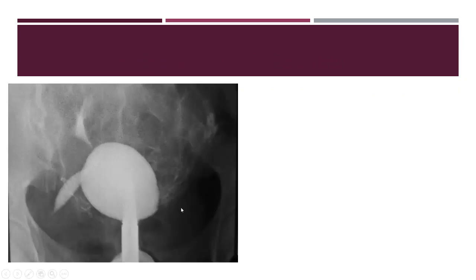Oh, what about this case? I have two endometrial horns, but what is this? It was a very odd appearance, but you have to do ultrasound. If you have a very odd appearance, you have to have a look by ultrasound.